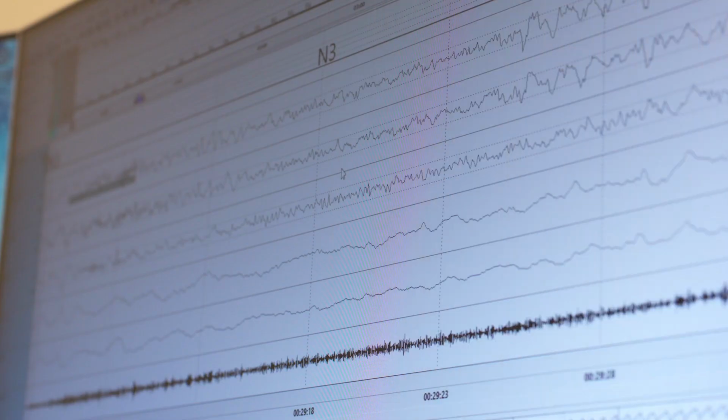Now we have it here. Beautiful delta waves, also called slow waves, when they are between 0.5 and 2 Hertz. And these K complexes, if they increase the target, may even be included, as in this case. There is a K complex there now, but this is a beautiful stage 3 sleep.